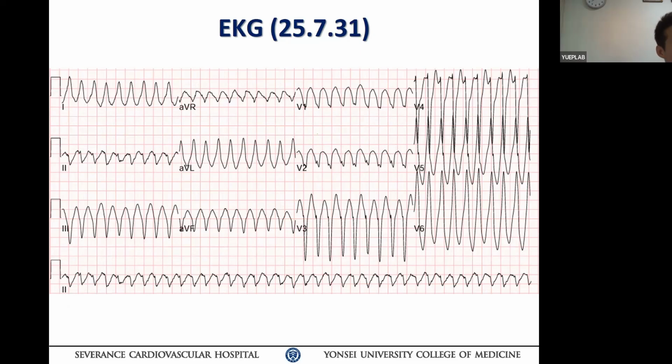So therefore, if you look back to a long time ago, there's one criterion published that also tries to differentiate VT and SVT. You use the initiation slope divided by the offset slope, and actually there is a discordance of your V4 and V5.